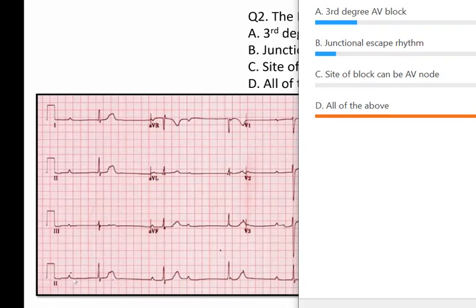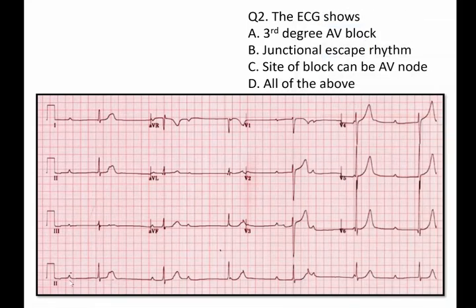Now let's look at the P wave. The first P wave is here. I believe my pointer is visible. The second P wave is on the T wave of the next QRS. The third P wave is here. Fourth is again here. Fifth is somewhere here. And sixth is here. So you see there are more P waves than QRS complexes.